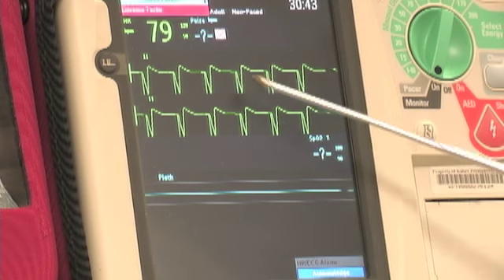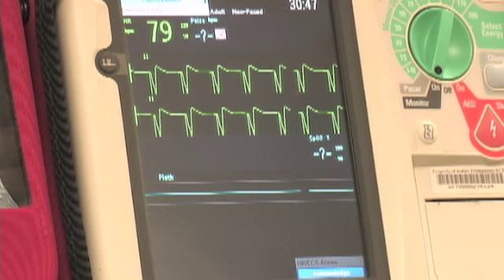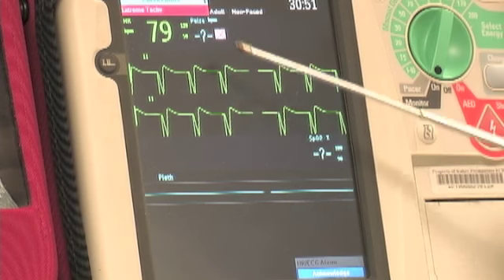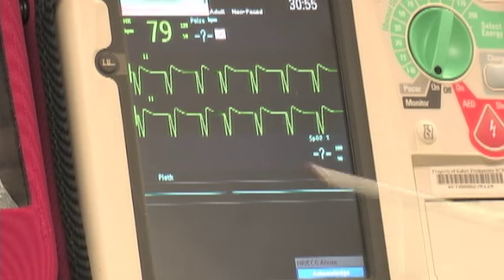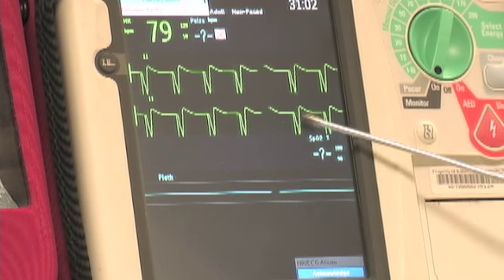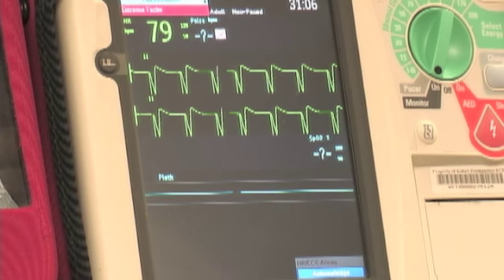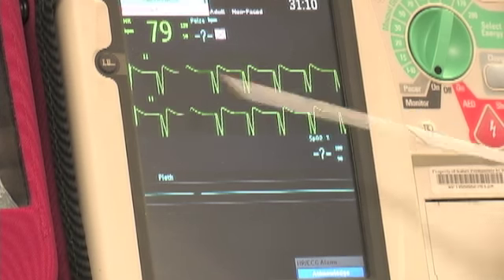So this is actually a ventricular paced rhythm. So the pacer is going to be on. It looks like it's functioning because consistently you're seeing a pacemaker spike followed by a wide QRS each and every time. If this is created by a transcutaneous pacer, it looks like you've got electrical activity, you've always got to double check your patient and make sure there is mechanical capture as well. And the patient should have a pulse at a rate of about 79.